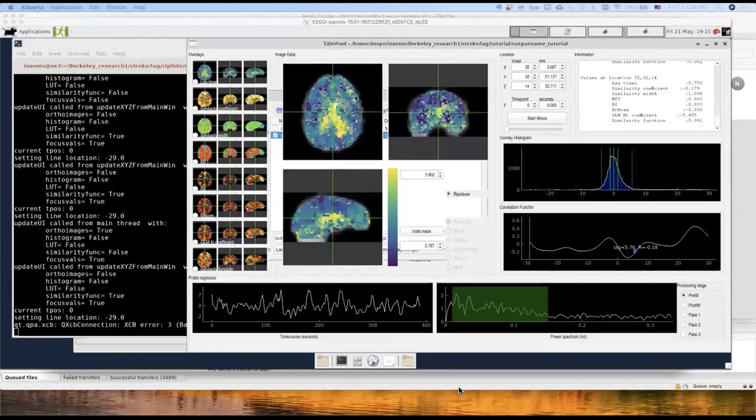So the first thing is the lag time. This is the max time map that I just showed you before. This tells you what is the time at which the cross correlation with the refined regressor is maximal. You can see a spatial view of the map right here. You can play with the range or the color map here.